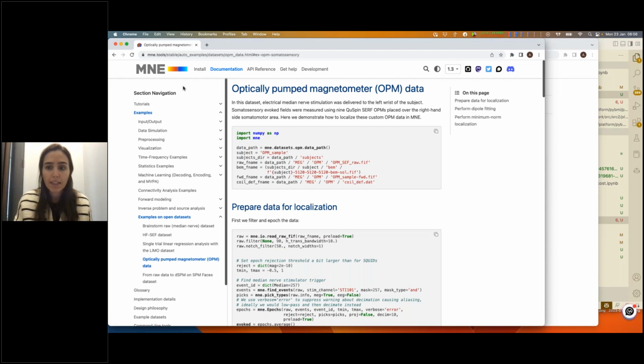So is it possible to get the latency values and amplitude values in a CSV or JSON file? That would be evoked.get_data and then two lines of NumPy code and then one line of pandas code to write the CSV. When I say this, it might seem a bit complicated, but it's kind of a trade-off. How much does MNE give you a one-line solution for every possible use case?